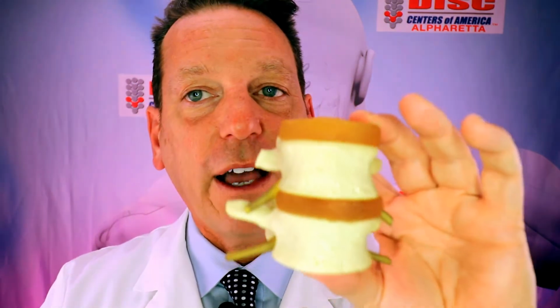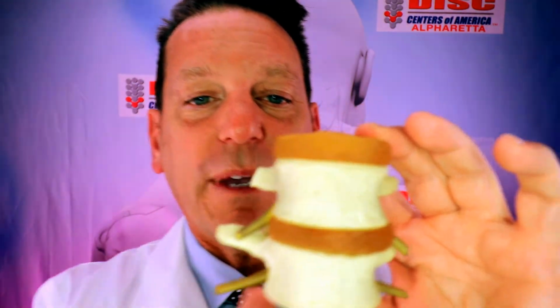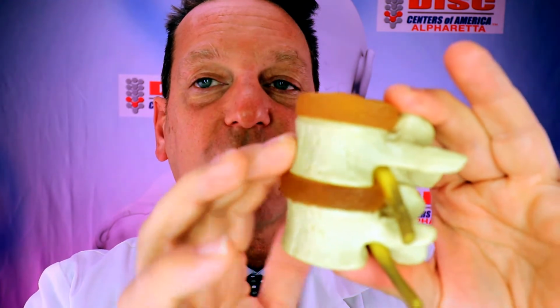I'll show you on another model here what can start to take place if you lose the ability of the segments of your spine to move properly, and what can happen to the disc. So when you read your MRI, you have a better idea. When you first look at this model, this is a model of a healthy spinal column, and there are just a couple of basics we want to look for. Number one is that the front of the bone should have a very nice smooth shape. It means there are no arthritic spurs, which usually means the bones are very healthy.